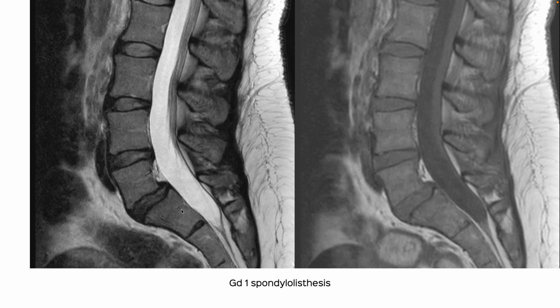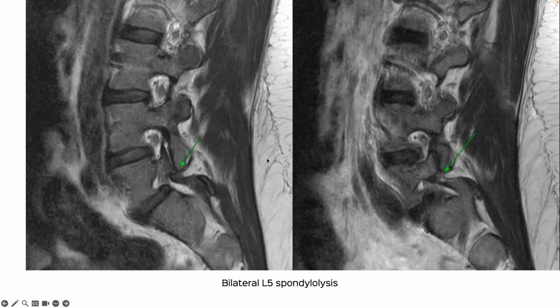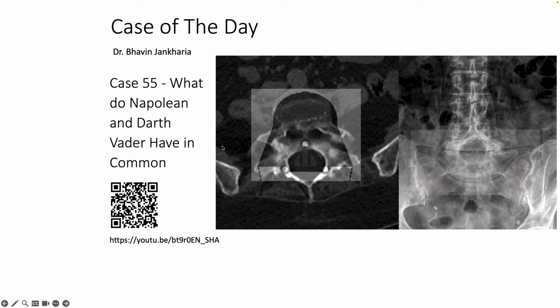So, this is a 37-year-old with back pain, has grade 1 spondylolisthesis of L5 over S1. So, clearly, we should look at the pars, and you can see a defect on both sides, elongated pars with a break, and this must have been an injury in the past, and that has also led to this unusual shape of the pars, which often happens with these long-standing defects.